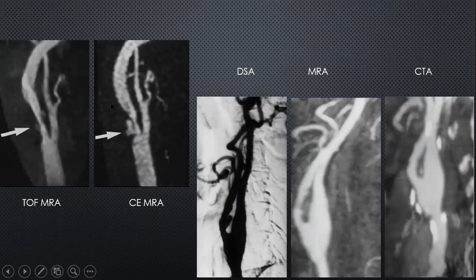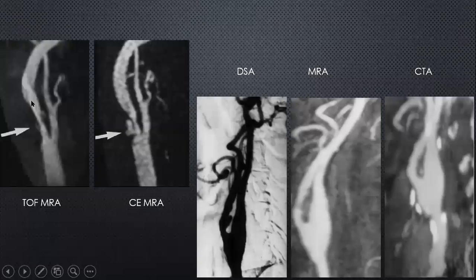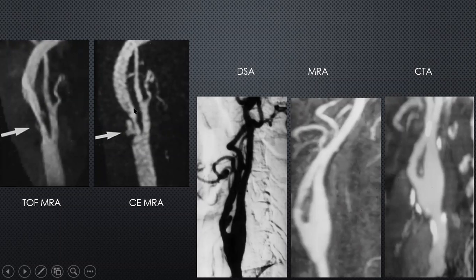Regarding the neck vessel imaging, of course, you can do an MRA. For example, this is time of flight, this is contrast enhanced. And just to highlight how contrast enhanced MRA is much more useful in analyzing the morphology of this carotid bifurcation. This is the external carotid with the branches, because you can then see not only the stenosis, which is of course relevant, but you can also see these ulcers which have started to develop, making this plaque, which is this filling defect, a much more fragile plaque, with a higher risk of embolism.